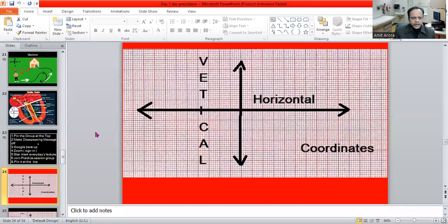Welcome back, friends. As I promised, we are going to start from the very small square of ECG paper. First you must know there are two coordinates. Everybody knows what coordinates are; you have learned all this in mathematics. We have a vertical coordinate and a horizontal coordinate.